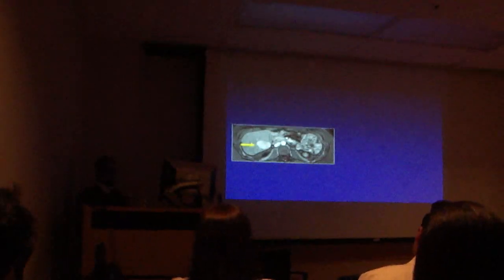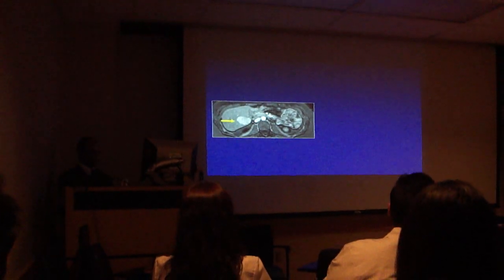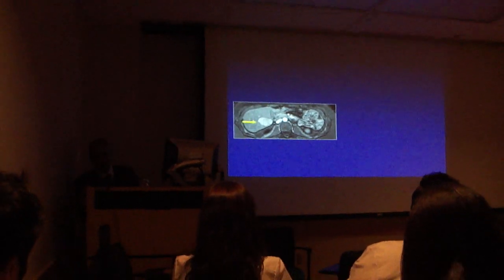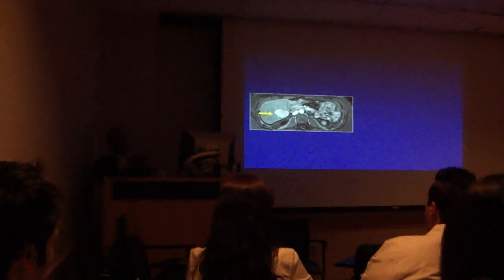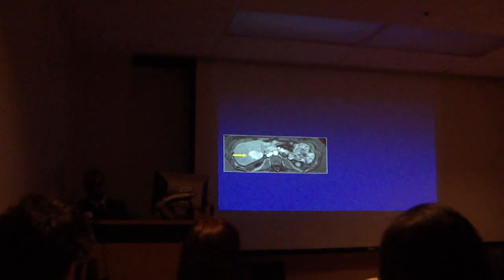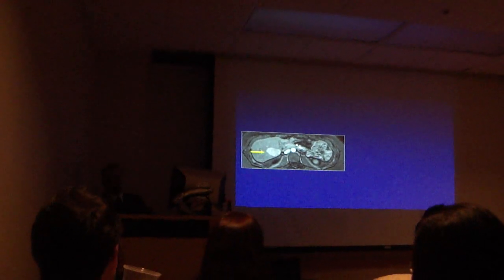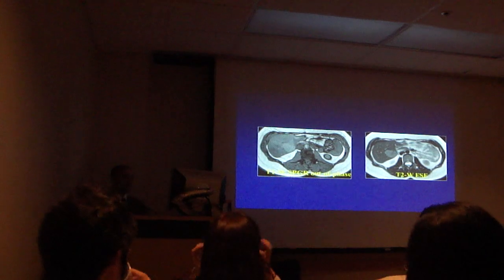But who wants to take a guess at this lesion? Worrisome, not worrisome? No, it looks well defined. Excellent. This man picked me up, so I'm indebted to him already, but his answer is right, so I have to effusively praise him. He's given me a reason. But exactly, you take a pencil, can you draw it out? Absolutely, yes you can. What is the other thing that we are going to look for to determine worrisome or not worrisome? Washout, correct? So let's proceed.